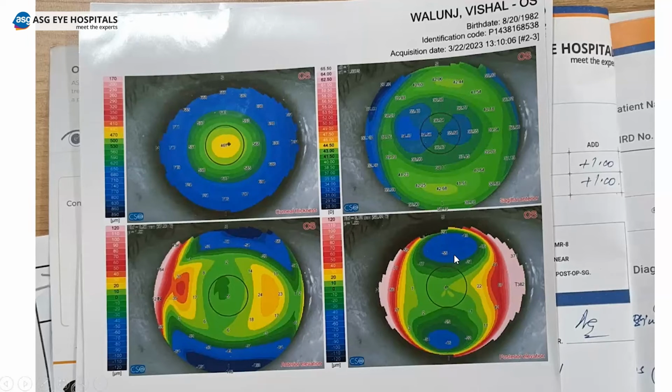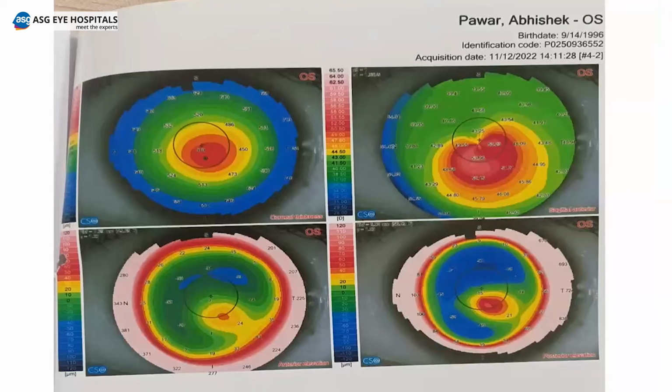Flattening and peripheral a little bit of steepening. So whatever steepening there is, it is cool there. What I'm just trying to make you understand is a point that you should try to see in every patient now, because this kind of thing is what you will see in the beginning of ectasias. It is easy to understand, then diagnose early ectasias. Okay.